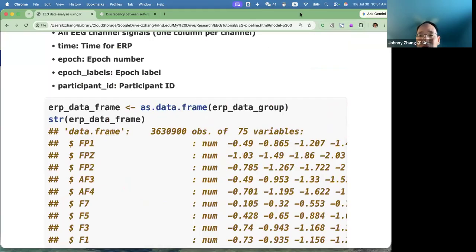So this is my ERP data, and I need a link. This is subject one, all subject one with a lot of this information. For the behavior data, I want to link each behavior data here, so I just repeat the behavior data.